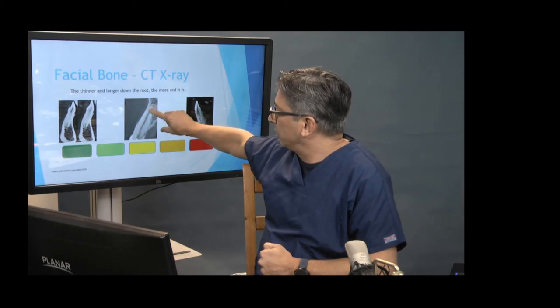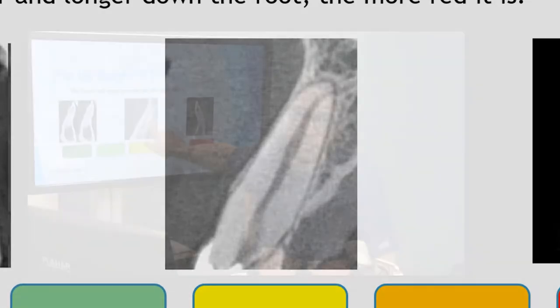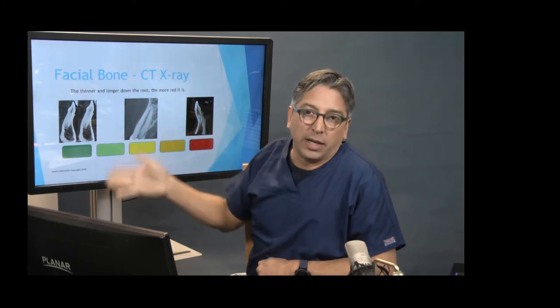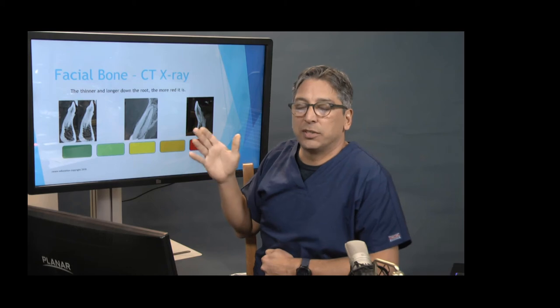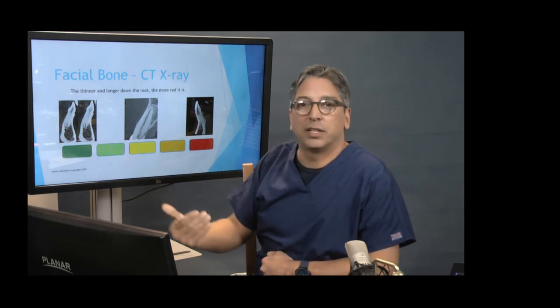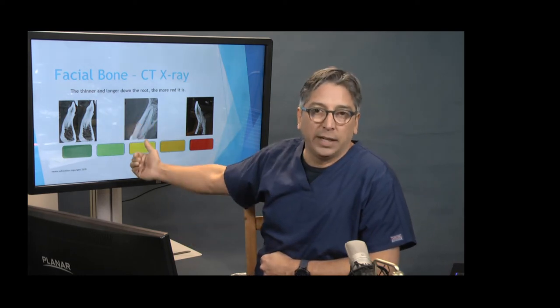Here you can see a sliver of the bone going through. I like this little picture because it's kind of right in between of having no bone. Many of these front teeth don't have a lot of bone in the front already to start. We always call it, in the dentist, call it a facial plate problem, where that bone is not necessarily supportive of the tooth or the implant. It's actually supportive of the tissue that is going around the front of it. So maintaining that's very important.